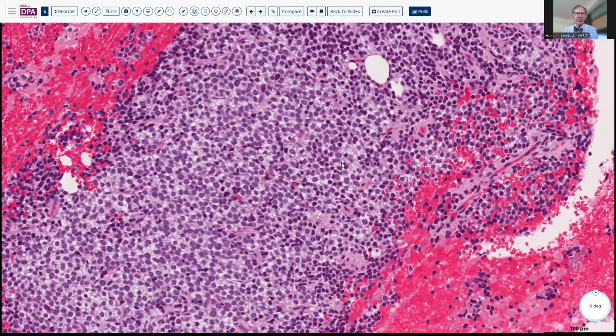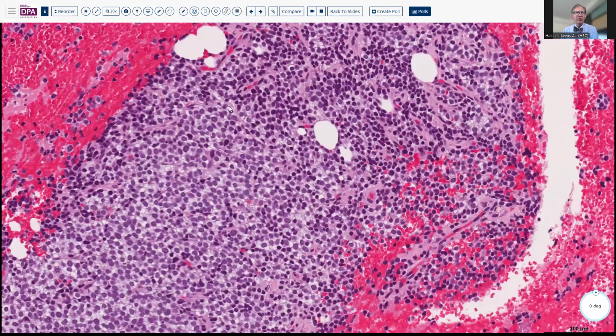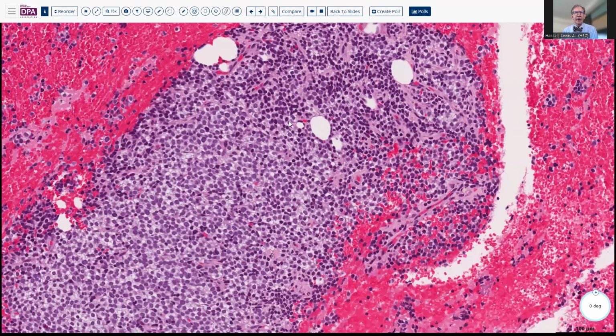This isn't an inflammatory process. We're not looking at abscess contents. So we've helped them right there. And on the frozen section evaluation, we could certainly tell them we have diagnostic tissue. It looks like a small blue cell neoplasm. So we're really looking at the differential between lymphoma, small cell osteosarcoma, and Ewing sarcoma, pretty much, in terms of the differential considerations.